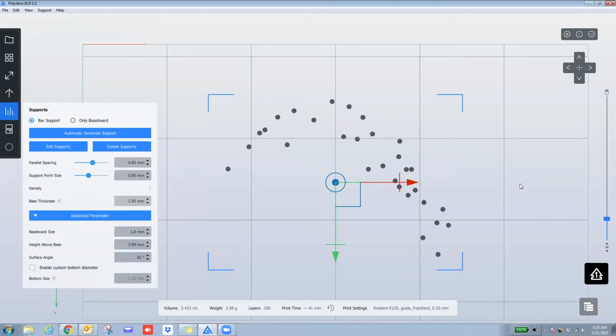We're going to keep clicking until we start seeing our surgical guide appear. You will see a blue area here. This is part of our surgical guide. And as you can notice, it does not have a support attached to it. This would cause us a problem with our print. And this is one of the critical lessons of adding supports to any geometry.